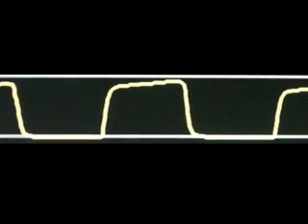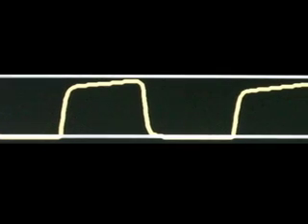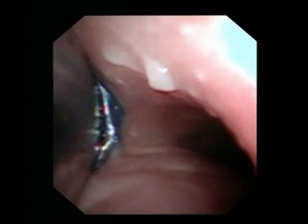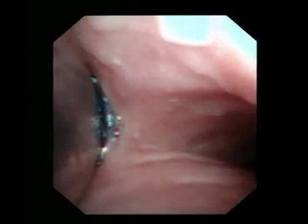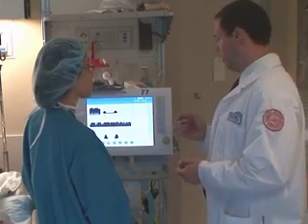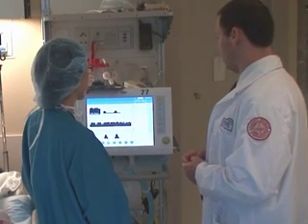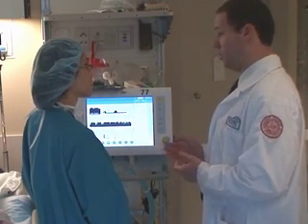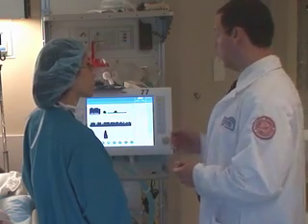In addition, a capnogram tracing indicates gas exchange and does not inform the clinician about whether the endotracheal tube is positioned properly, for example, whether it is in a bronchus or in the oropharynx. Capnography is useful for the measurement of the ventilatory characteristics of intubated patients, and it may reduce the need to measure arterial blood gas.